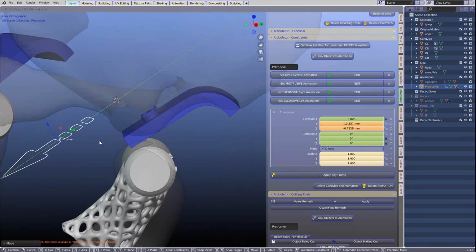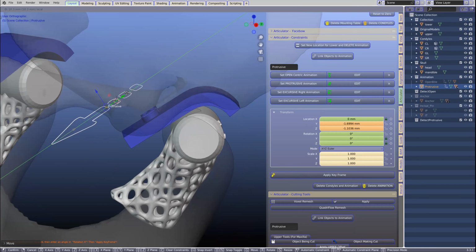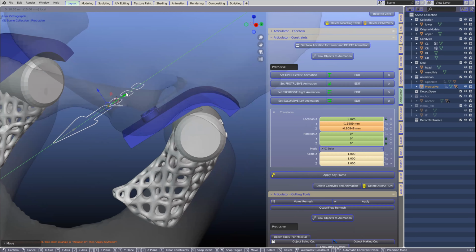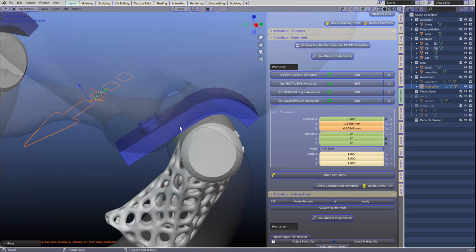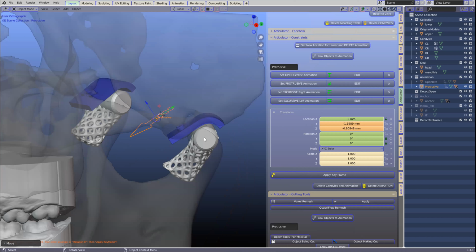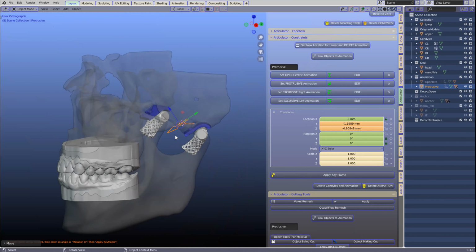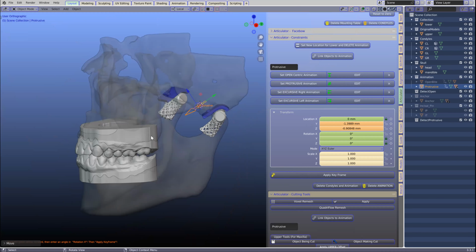Can you see? Maybe I need a notch over here. So this is obviously a special request. We're going to have to put a 2 mark or something. Can you see the numbers here? 0, 5, and 10. So we need to get it quite a bit more specific. I haven't had this request before.